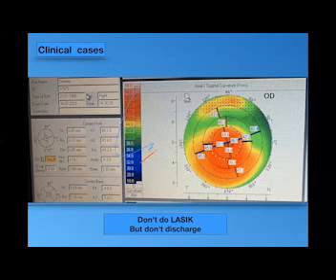Yeah, okay, it's a very good opinion, despite the intracorneal rings being used for regularizing the irregular cornea. It's not a matter of irregular cornea, but of non-understood corneal protrusion, because we used to see a corneal astigmatism. The corneal astigmatism in the topography is insignificant. So null.